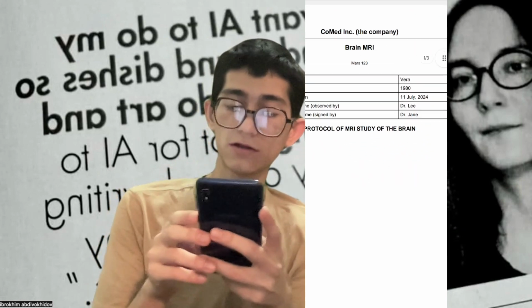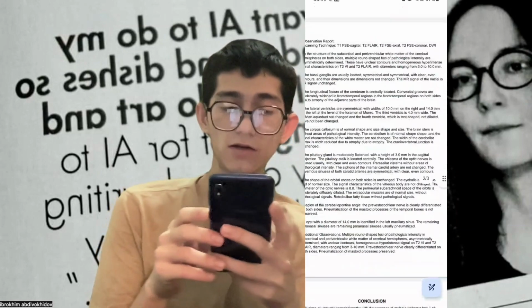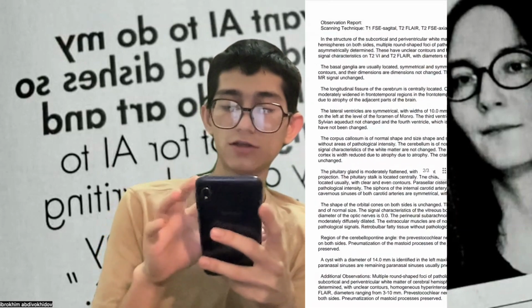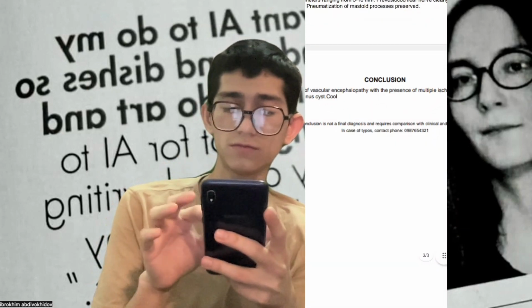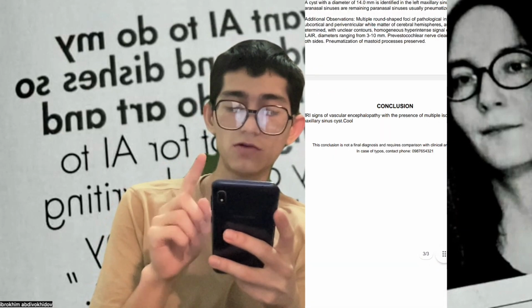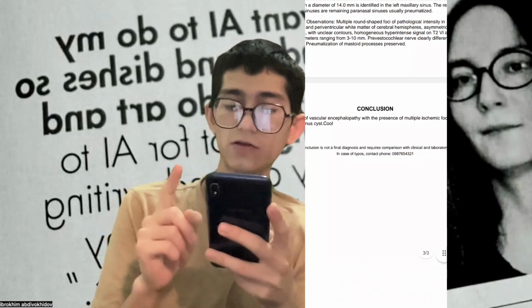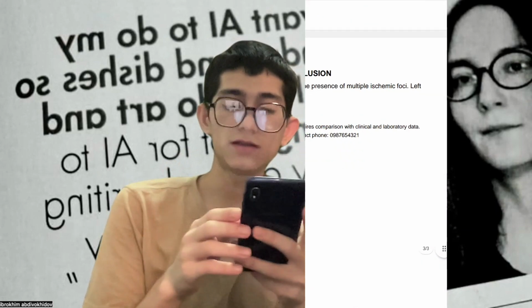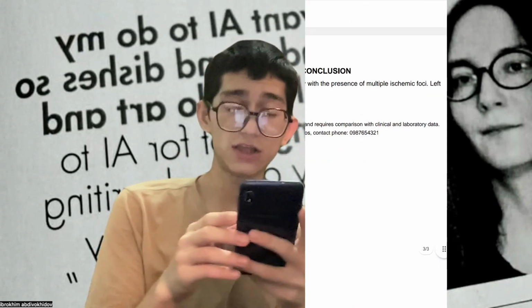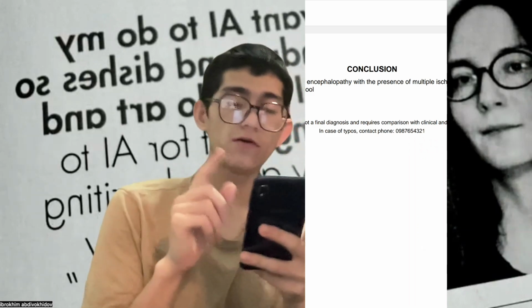And this is the protocol of the MRI study of the brain. Here you can see the observation and scrolling down, you can see the conclusion and also a note that this conclusion is not a final diagnosis and requires comparison with clinical and laboratory data. And there is the phone number of the hospital.